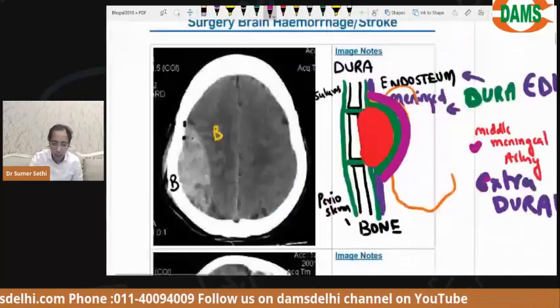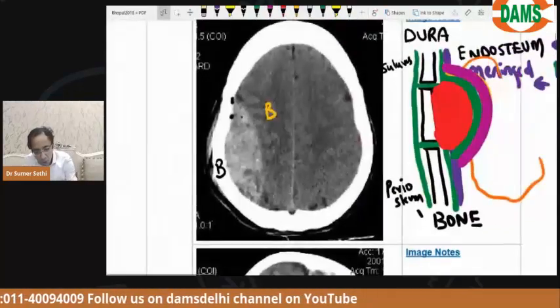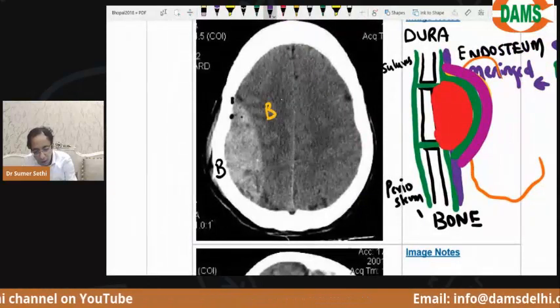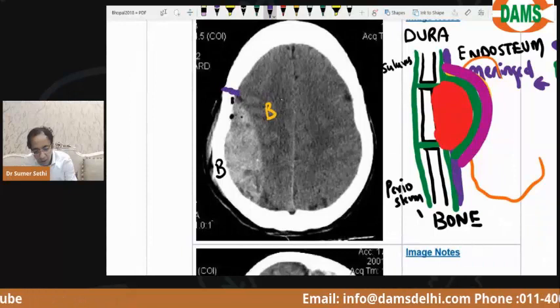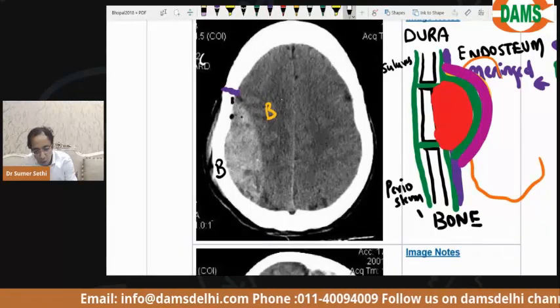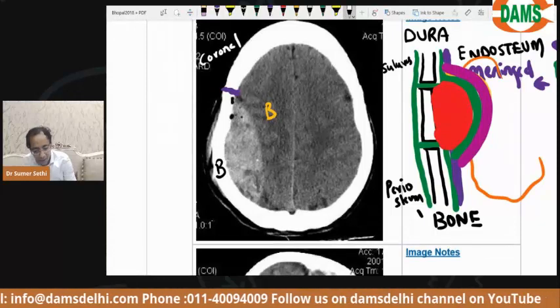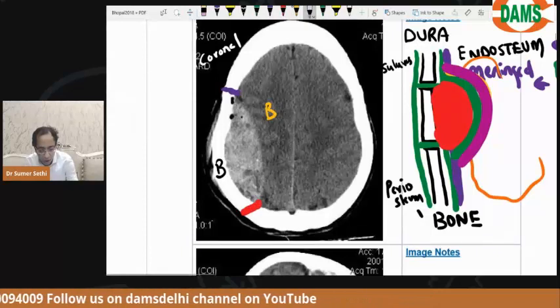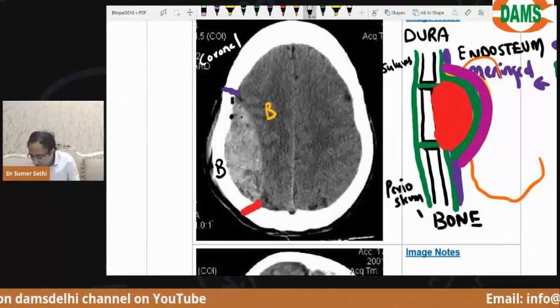Now, please look at it and answer. I want you to understand and answer, बच्चे है ना? ये bone देखेंगे, है ना? यहाँ पे होता है, we have our coronal suture. If you remember from anatomy, this is where you have the coronal suture, and this is where you have the lambdoid suture. Okay, can you see?